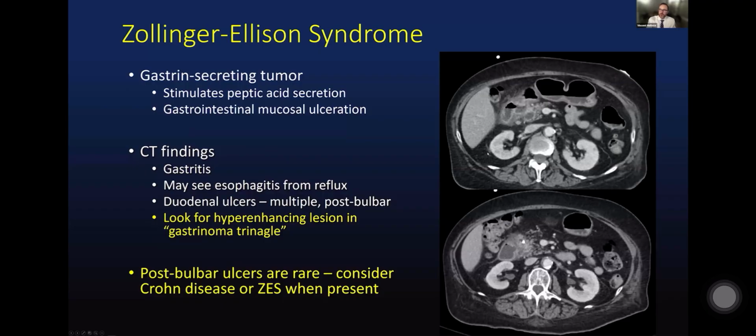It can be quite hard for us sometimes to differentiate these hyper-enhancing gastrinomas from surrounding lymph nodes. And so something like a dotatate PET CT might be helpful to identify a potential primary if they have elevated gastrin levels.